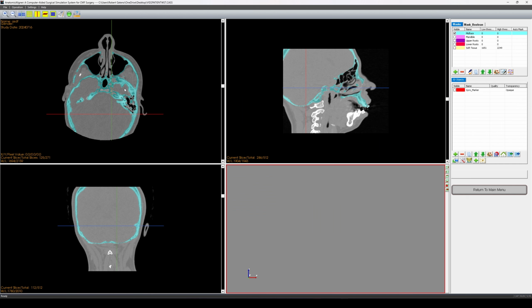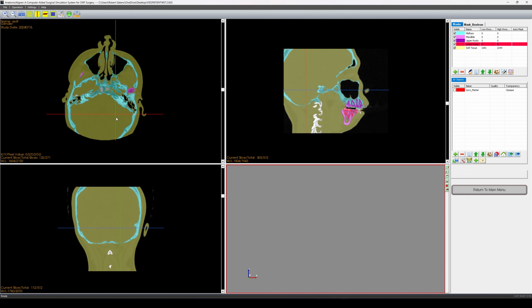As I had previously mentioned, these automatically generated masks are not perfect. They either select too much or too little. Although the cleanup is minuscule, we will have to go through every slice individually to ensure that these masks are as accurate as possible.